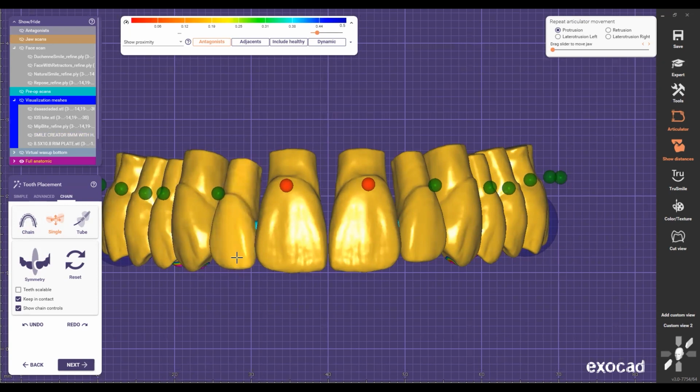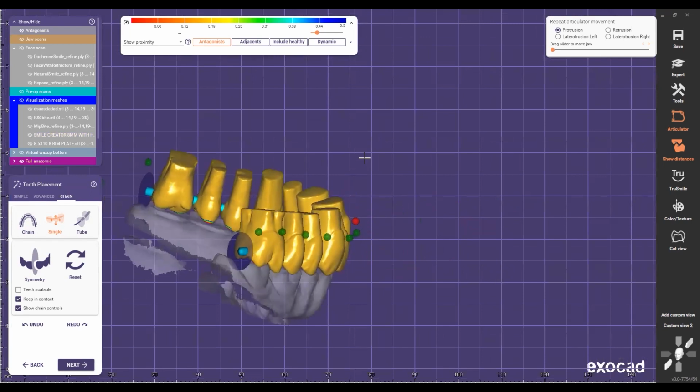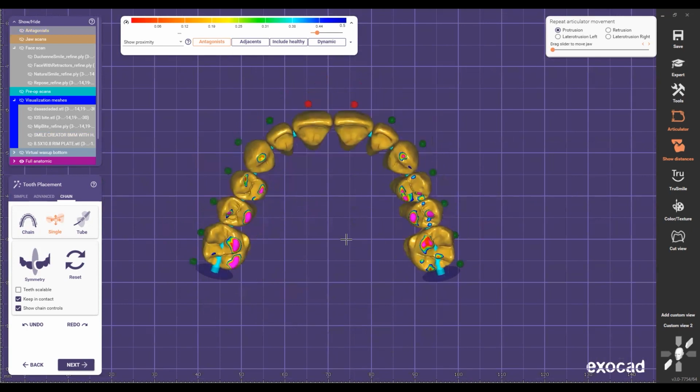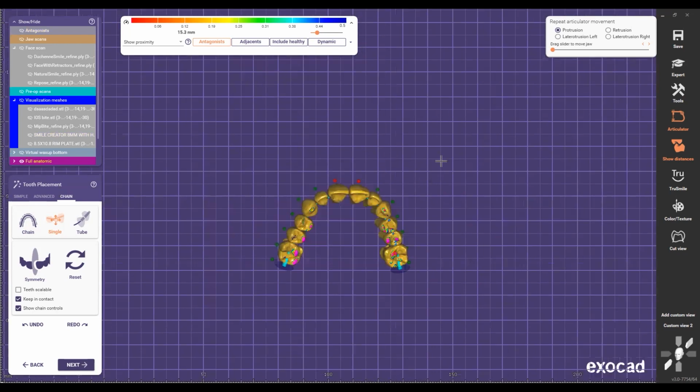Double check with the patient and the doctor if they like to have canines, centrals and laterals even, but for me, I like to keep them 0.5 a little higher from there. Then I start checking here, turning my, I just imagine doing this analog, putting the antagonist touching the tooth like this. And that's how you can make it easier to understand when you're doing these teeth setups.